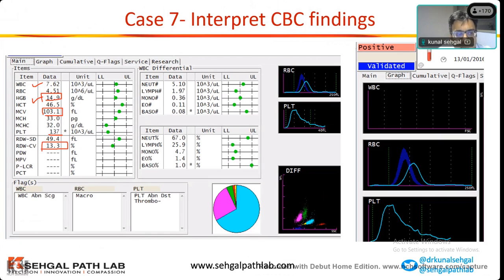Here, when you have macrocytosis with normal RDW, the first thing to think of is drugs. Alcohol, drug-induced changes, and all those kind of things need to be discussed. Also, the platelet level has to be realized.